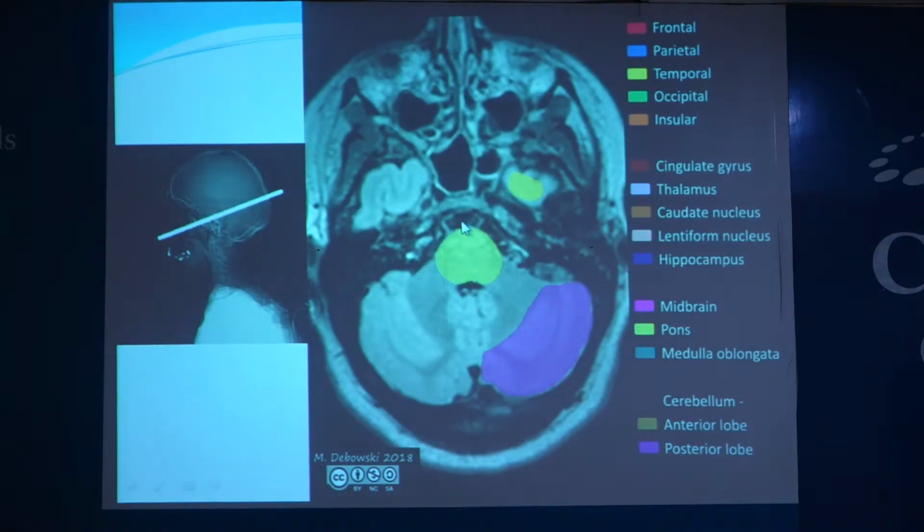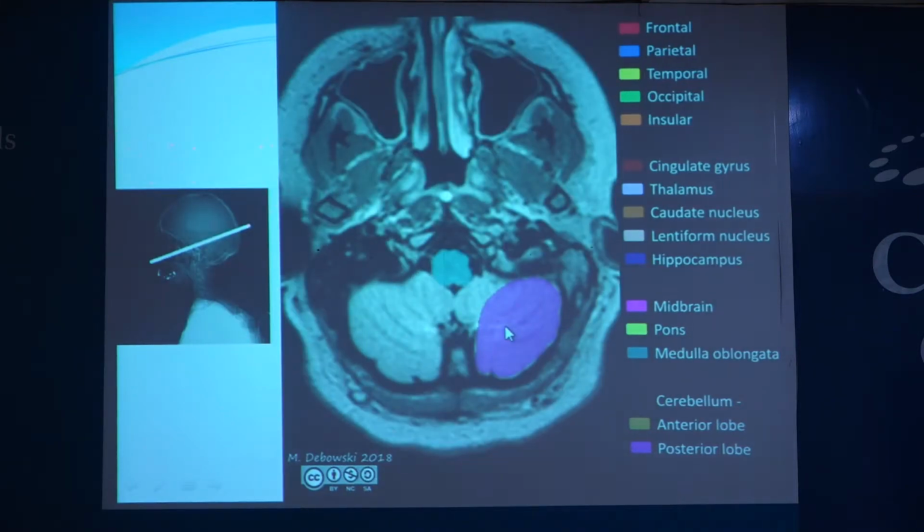And coming a little more down, this is the pons with the fourth ventricle posterior to it, the cerebellar hemispheres on either sides. Then this is the medulla oblongata. This is a much lower section with medulla oblongata, that is the cerebellar hemispheres. Anteriorly you can see these are the maxillary sinuses, the nasal cavity, this is the nasopharynx area.